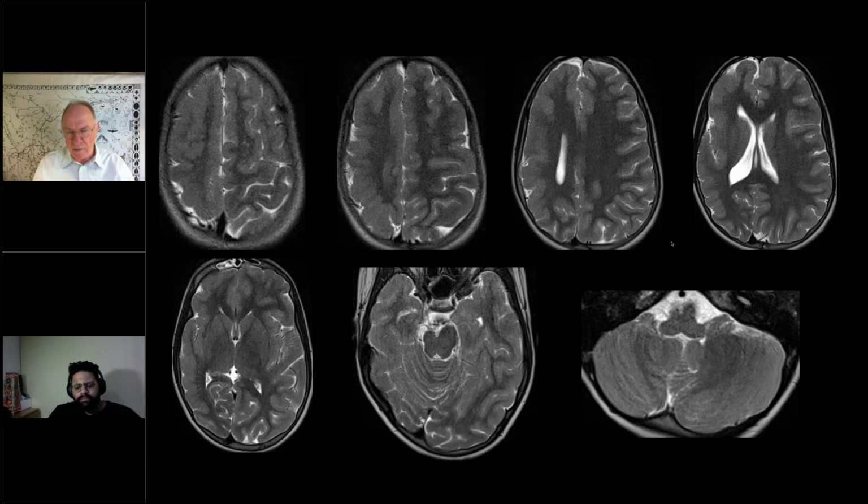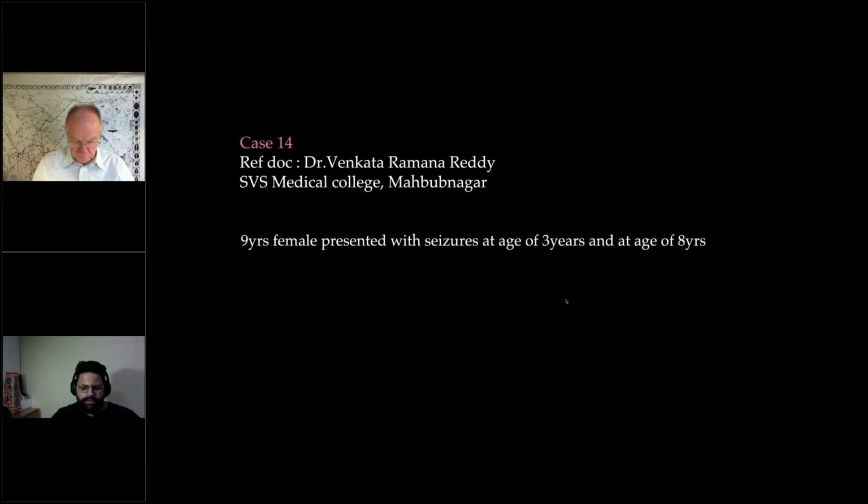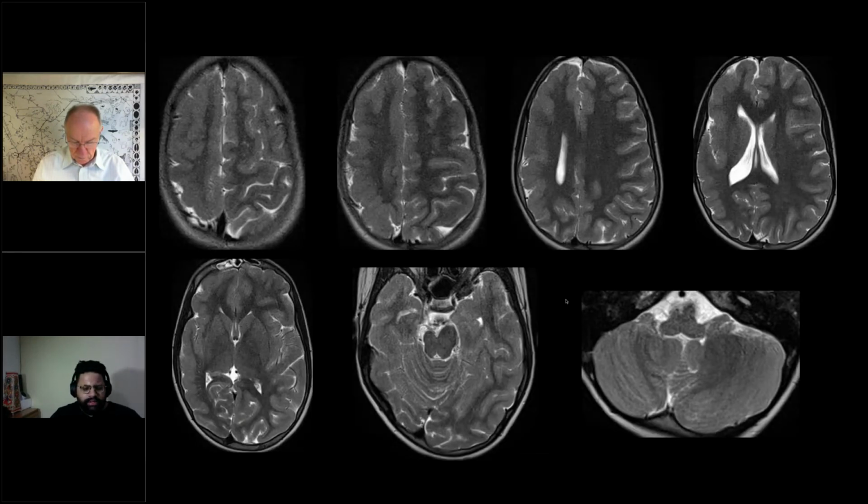It's strictly unilateral, if I understand correctly. Usually the cerebellar hemispheres are symmetrical, but in terms of hierarchy, I think the main finding is the strictly unilateral situation in the brain. I would expect that this child has some mild hemiplegic cerebral palsy on the left. I'll check with the clinicians, but yeah, I would agree with you. It's probably an acquired insult resulting in these changes.